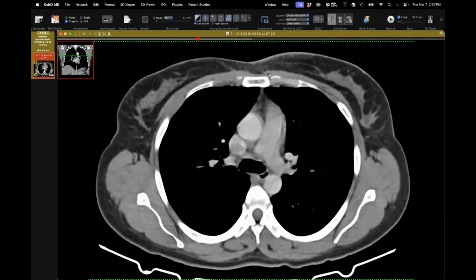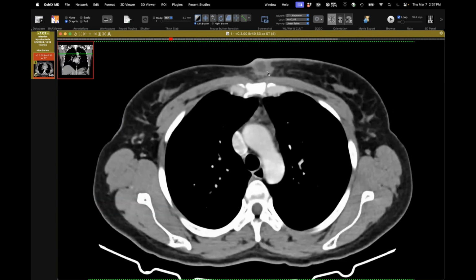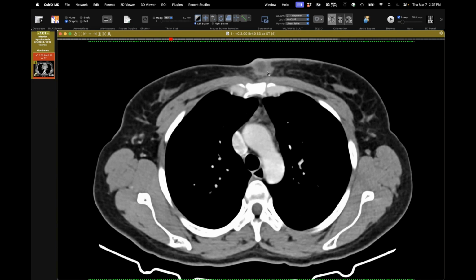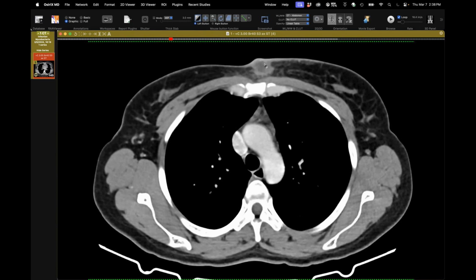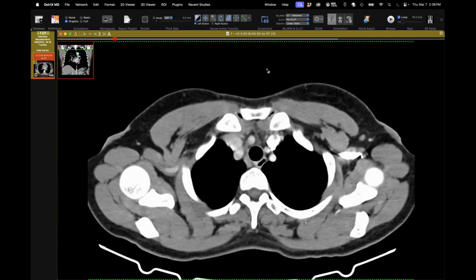The lungs, there's nothing going on in the lungs. So they actually biopsied one of the lymph nodes, and it showed necrotizing granulomatous inflammation, and they grew tuberculosis from it. So this is a case of a tuberculous abscess. I don't even know if there's a name for it. A tuberculous abscess in the skin or under the skin here. There's probably some names at some point somebody gave it.